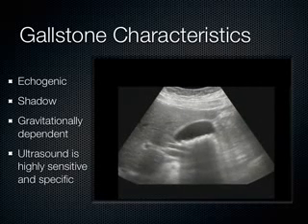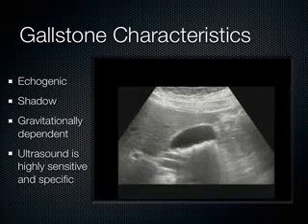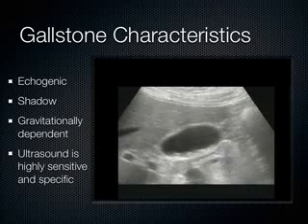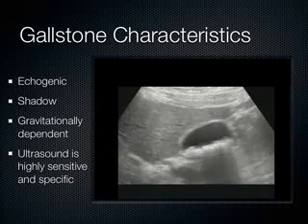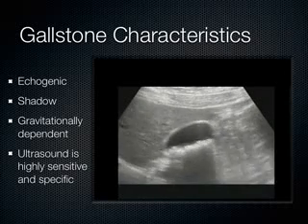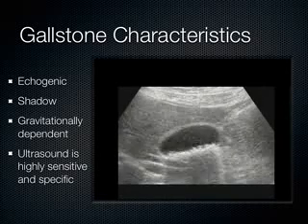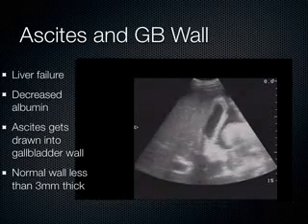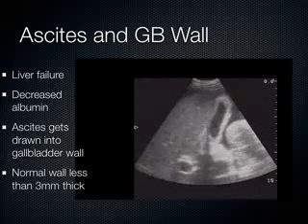It beats out CAT scan because with a CAT scan, you often miss on that one little cut, you miss the gallstone. And I've got plenty of examples of that from the literature and anecdotally, where ultrasound found stuff that the CAT scan missed, especially when it comes to gallstones. And this is just another example here of the gallbladder wall.